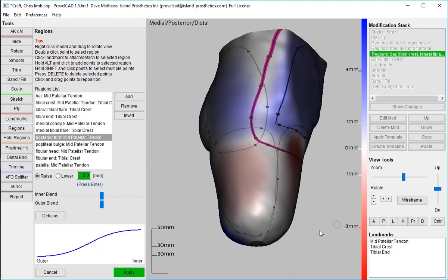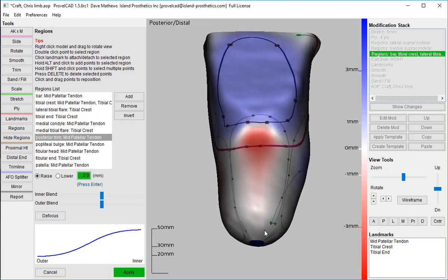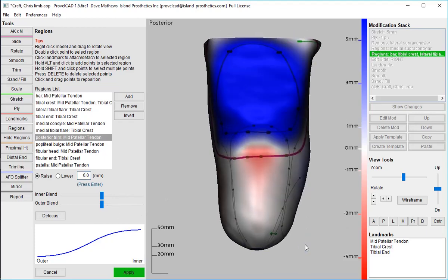Posterior trim. Oh, this all gets cut away anyway. I think I'll give it some magnitude so that it's easier to find the trim line. We'll just enter a 6. How's that? Oh, there was our magnitude. Maybe we'll do a little reshaping here. Yeah, these are boundary points, apex points. It goes from the boundary to the apex.